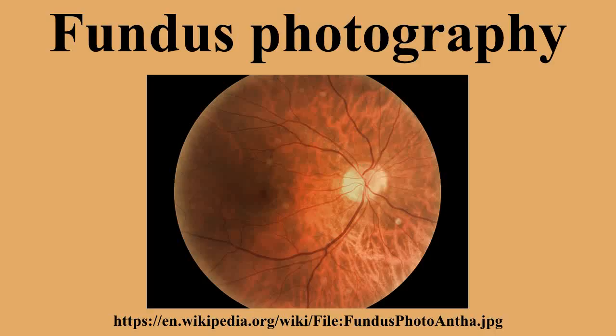This allows better contrast for viewing retinal blood vessels and associated hemorrhages, pale lesions such as drusen and exudates, and subtle characteristics such as nerve fiber layer defects and epiretinal membranes. This is considered to provide a superior method of observing NVE and NVD than color photography in diabetic retinopathy progression assessment. Red-free photography is also regularly used as a baseline photo prior to angiography.